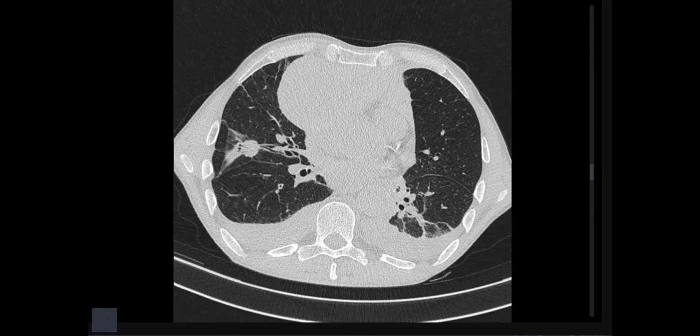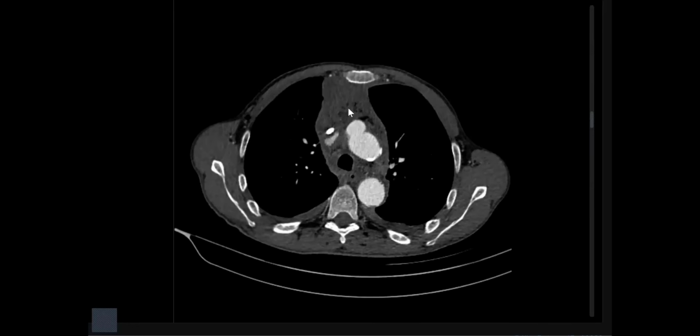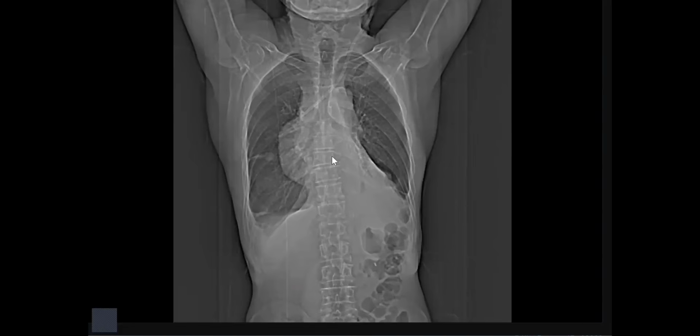Very good. We have here some lessons. One of them is to complete your study. I know you detected the diagnosis from the mediastinal window, but please just mention that in my routine practice, I will do lung and bone windows. Every case, finalize it like this. From the start, you did very good, my friend. You caught the main pathology. You described it well.